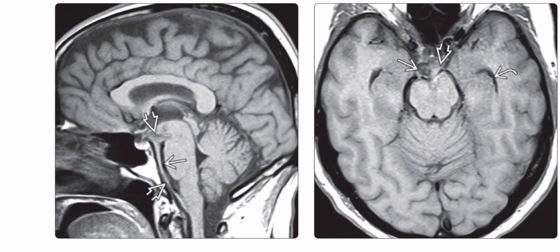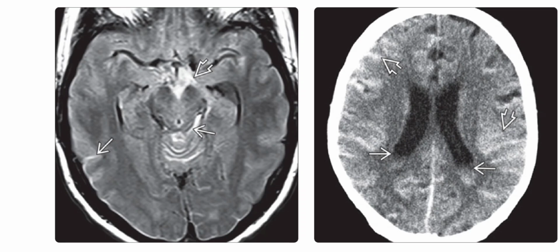Axial T1 weighted MRI in the same patient shows a nice contrast between the iso-intense with brain dirty CSF and the more normal appearing hypointense dark CSF in the cistern and temporal horns. Left is the normal CSF suppresses on FLAIR. FLAIR scan in the same patient shows that the CSF in the suprasellar cistern is abnormally hyperintense.